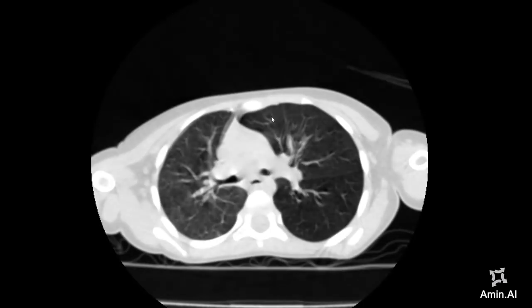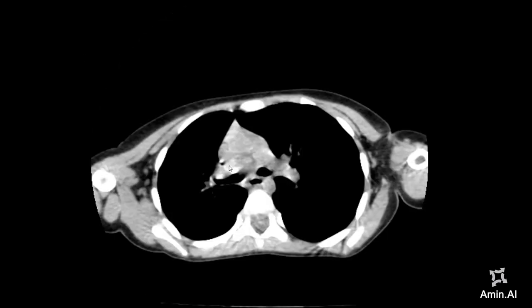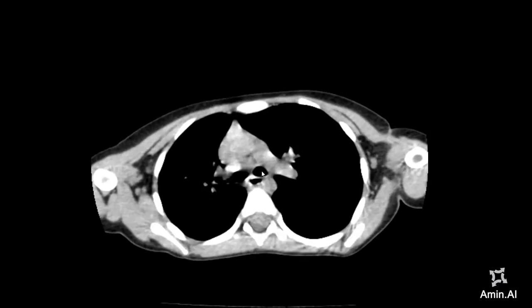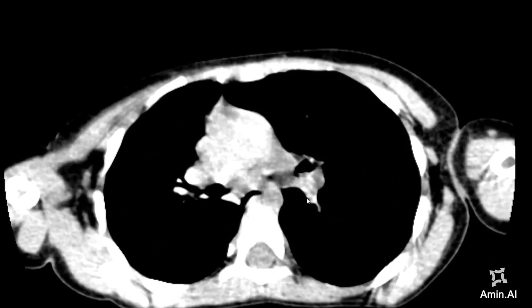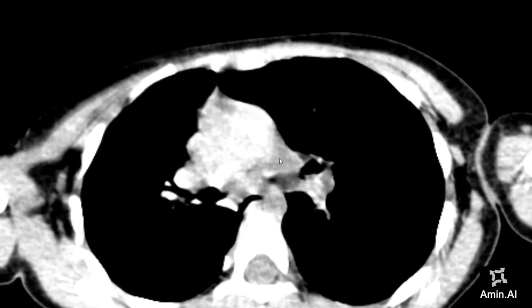So this raises a suspicion of a foreign body, and as I've now done some windowing on it, you can follow the left mainstem bronchus, and you can see that there is a relatively hypodense area in this region which is causing the obstruction. It is relatively hypodense as compared to the adjacent soft tissues, and if I do an attenuation measurement of it, it's around minus 45 to minus 40 HU.